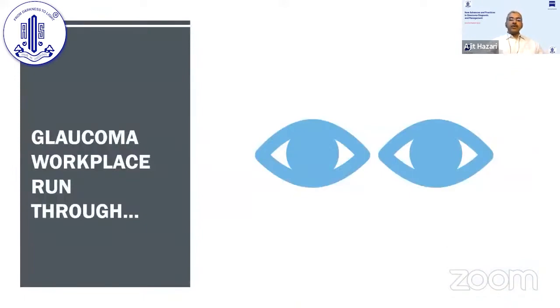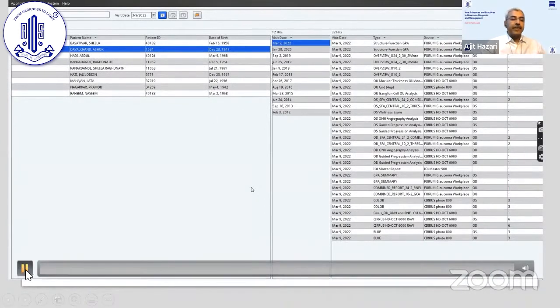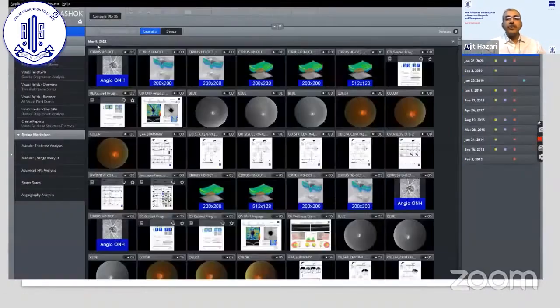So we'll go over a short video in which I'll show you typically how I go through the Glaucoma Workplace screen when I'm evaluating my patients. So this is the starting screen where you have the patient's name here and all the tests that have been done for that patient, and it's very intuitive. You just double click on it and it opens up the screen.